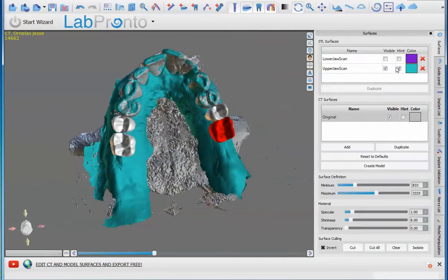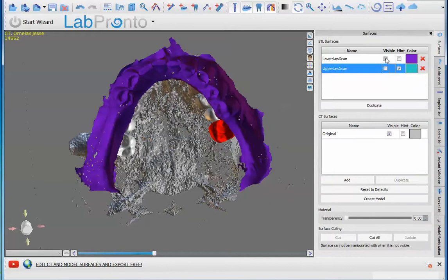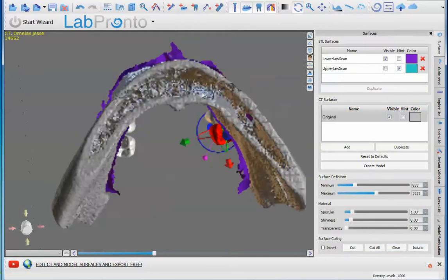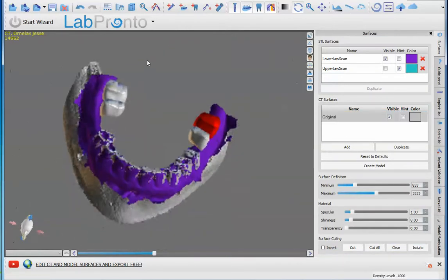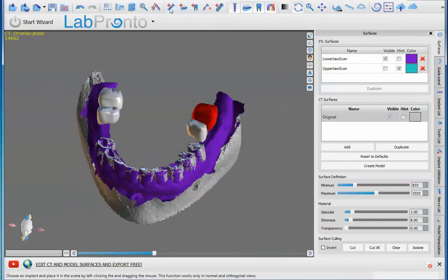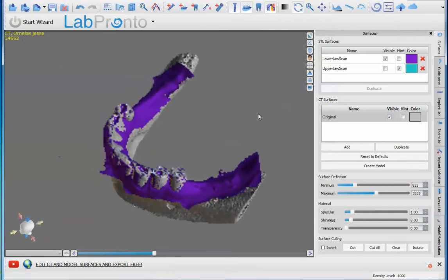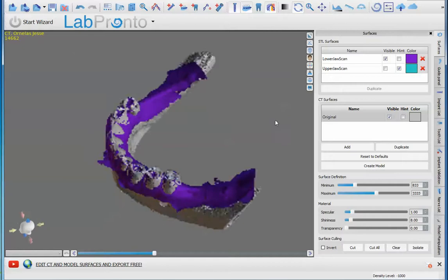So we'll go to surfaces, choose this off, go to lower, and click on this and just press invert off. And sometimes it'll keep the teeth like that. So what you do is just go up here and click teeth off, and then we'll start adding our lower teeth. So we need one molar here.